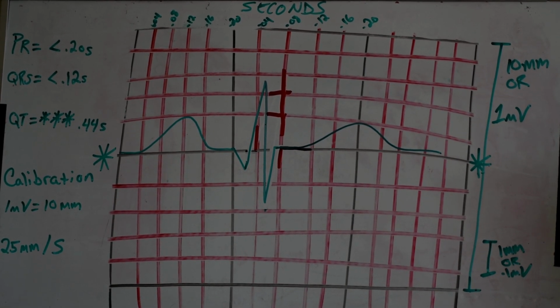As I've stated in previous videos, you should be pretty familiar with this readout. This is a quote-unquote normal readout of most leads you will find on an EKG. I do a video where I will cover what the different leads look like and why we would look at different leads on a 12 lead.